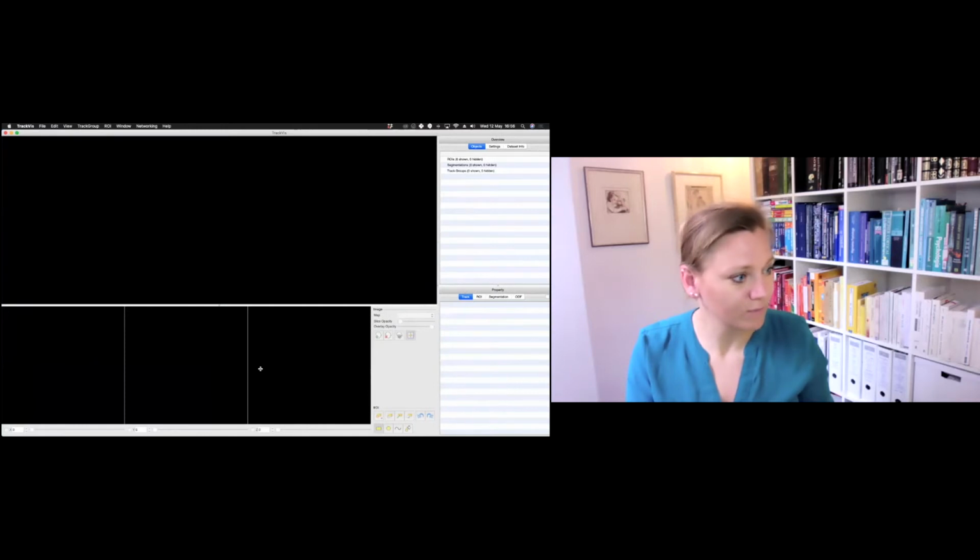If you could open Trackvis. Okay, so you now can see my screen. It's a blank page.